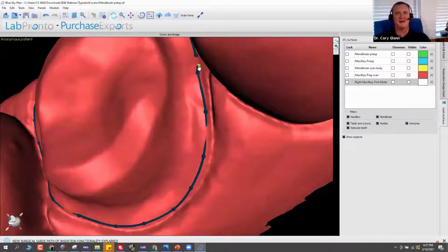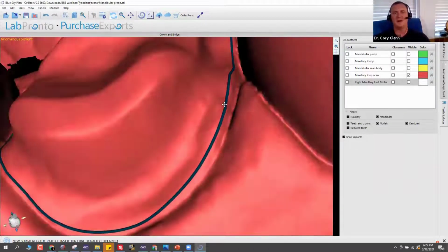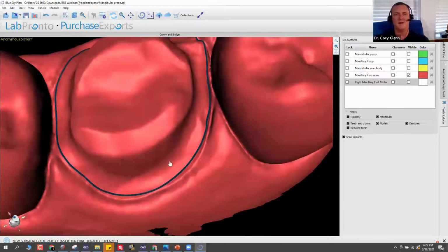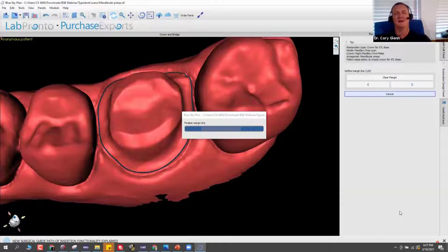And then your last dot, you need to be sure that you drag into the first one to close the contour. So that's our final margin proposal. If I see anywhere that I've dropped off, I can just hold shift and then redraw that spot like that, and it will refine that margin. So we're just in a wizard workflow. That's step 1 of 6. I'll click next.